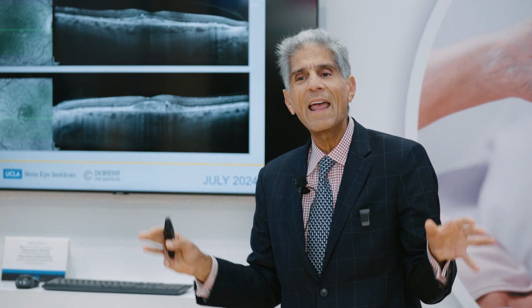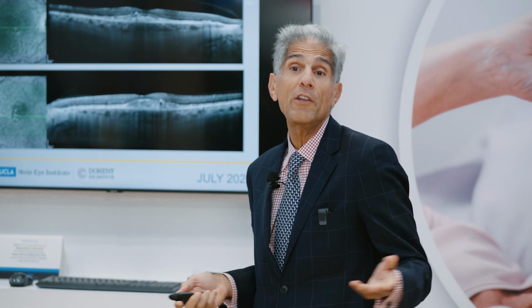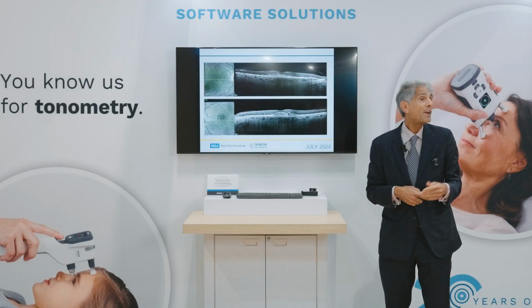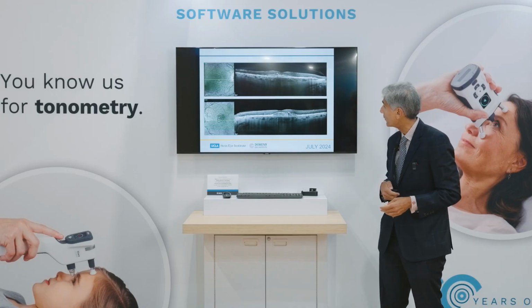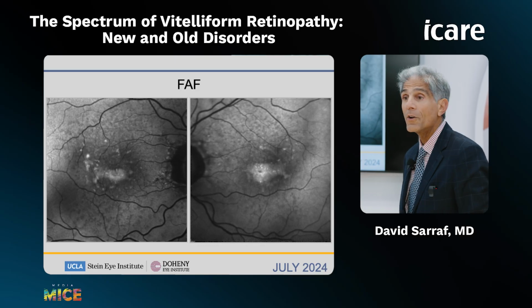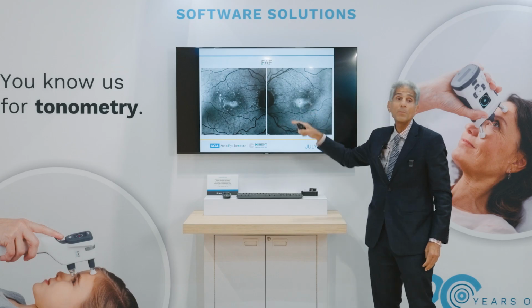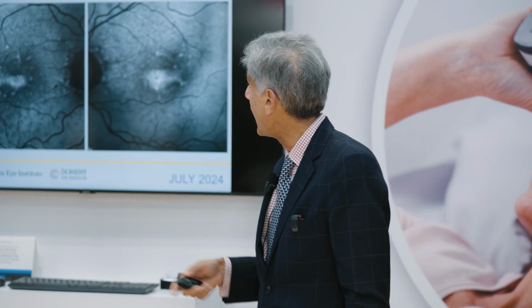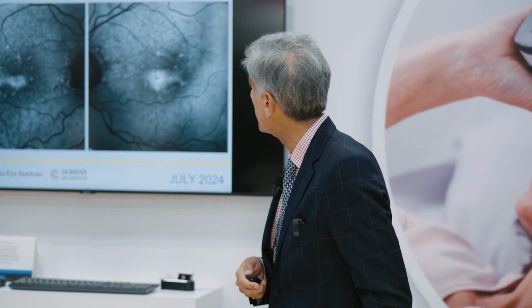He didn't have any layering or family history to suggest Best disease, which is the most common cause of genetically acquired vitelliform dystrophy. And here you can see on the autofluorescence how these vitelliform lesions emit hyperautofluorescence, and so they appear bright on the autofluorescent image.